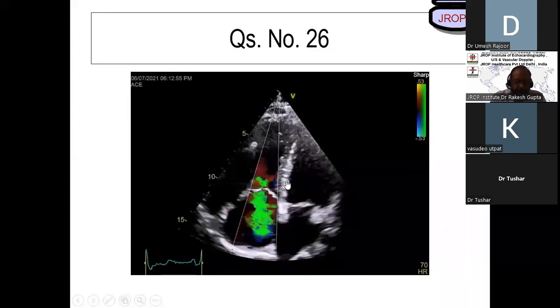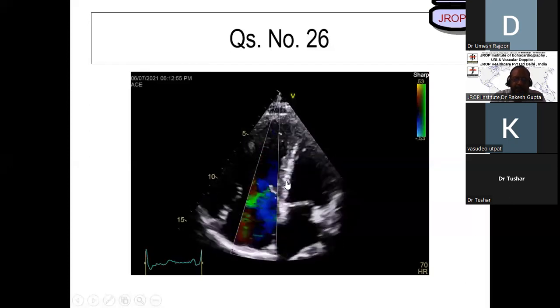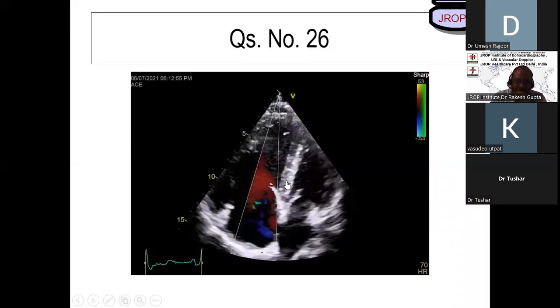This is a 4-chamber apical view. Right. Tricuspid regurgitation and ASD. Right. If it's tricuspid regurgitation, ASD is present, why am I showing this picture again and again? Look, very specific thing which is seen in this image. Go beyond that. You've already scored about 2 out of 4.